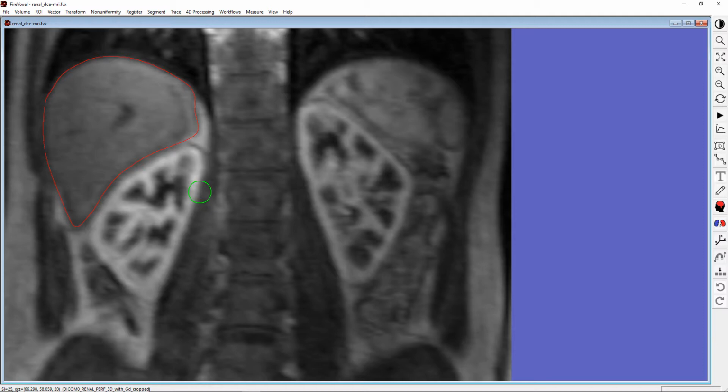The aperture must strike a balance between accuracy and efficiency. If the aperture is too large, MagTrace may snap to the wrong edges. If the aperture is too small, the benefits of magnetic snapping will be diminished, and MagTrace will perform similarly to manual tracing. Now click along the outline of the kidney. You can see that the control points snap to the edge of the kidney.